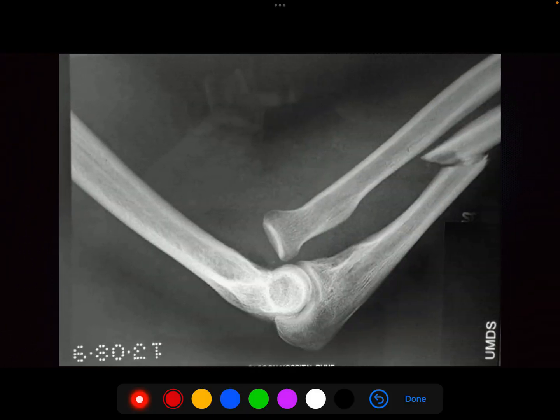So, just to revise, let me talk about this X-ray using our 3-line format. The given X-ray shows the elbow joint in lateral position with good centralization, neutral rotation and adequate exposure. I can see that the joint is showing the bones of a skeletally mature individual. The humero-ulnar articulation appears to be well maintained.